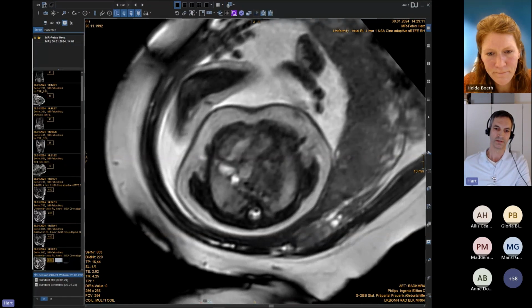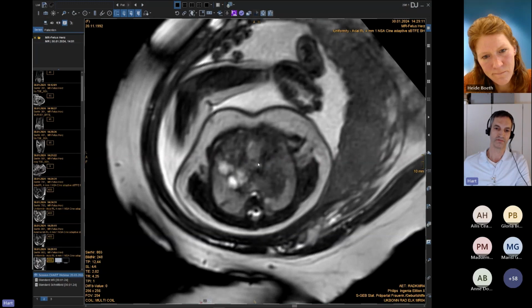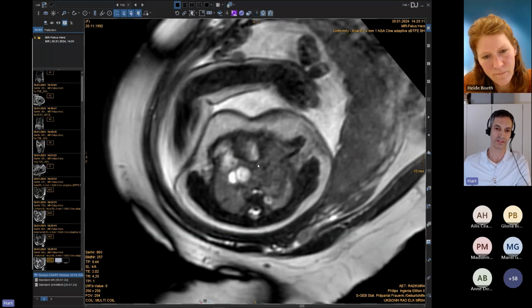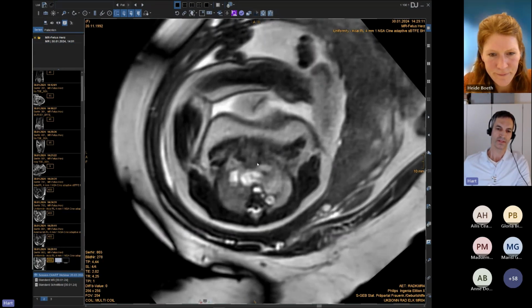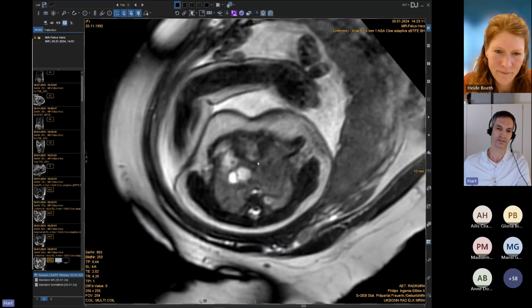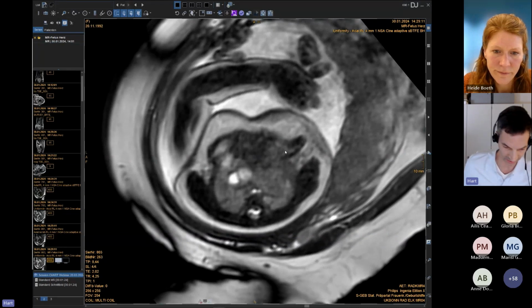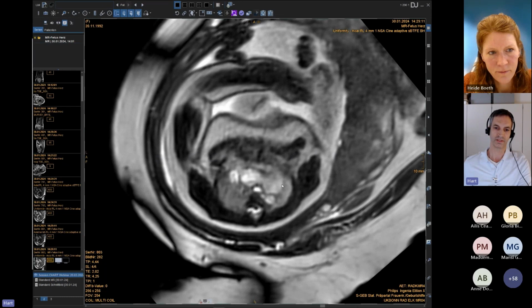We have the aortic valve over here. And this is the pulmonary valve, or let's better say, this is the position of the pulmonary valve. It's the absent pulmonary valve, the pinhole, and you see the jet turbulence over here for the systolic. This is the systolic image here, and the diastolic image over here. So you see we have severe stenosis and regurgitation in this child. Again, the pulmonary artery is enormously enlarged over here.